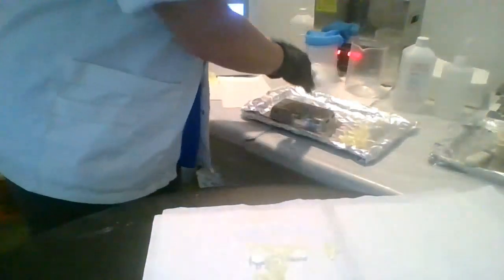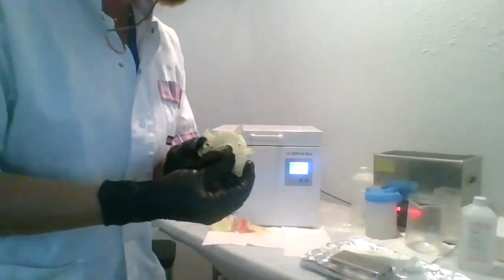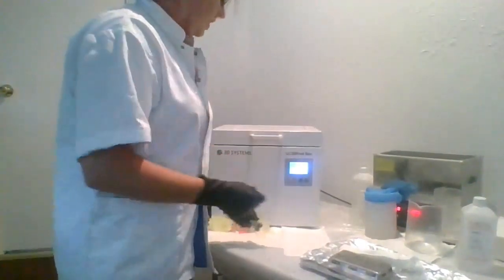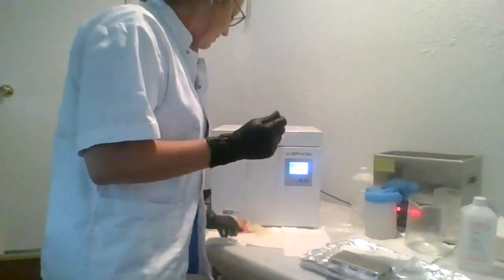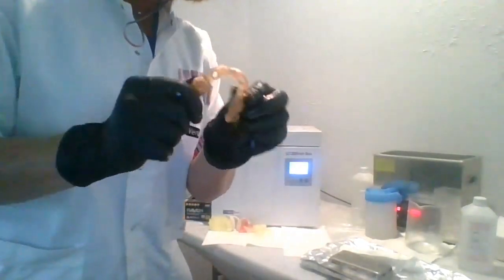And one more thing is after you clean those and they're ready to go into the cure oven, you can go ahead and put your sleeves in prior to putting them into the cure oven. I don't have the sleeves for this particular case, but if you put them in, you'll get a nice secure fit with those sleeves, same with your lab analogs. And this is what it'll look like when it comes out. It makes that amber color, which you already know.